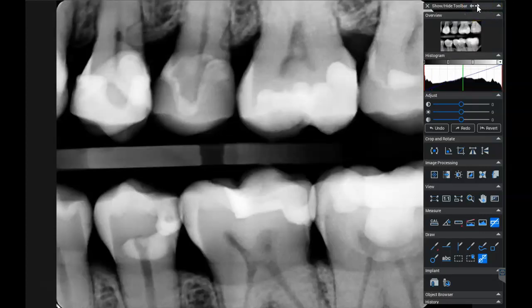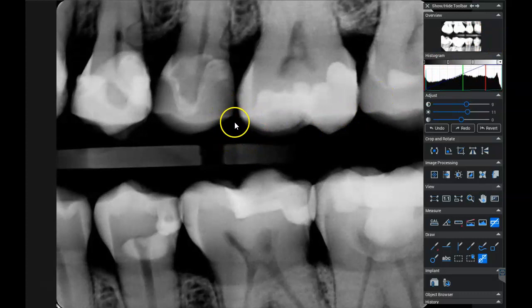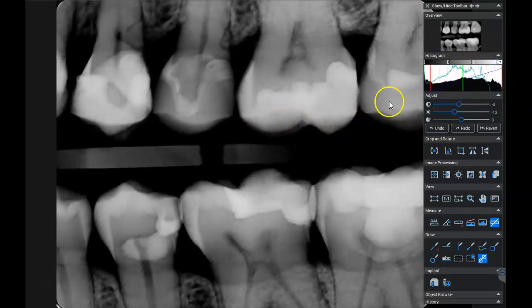Going back to here, okay, now this thumbnail does match this large picture, but I go to try to change the resolution, and again, it jumps to a completely different image. It's not the image I'm on. So this image and this image do not always match, even though on the screen you're cycling through one to the other.